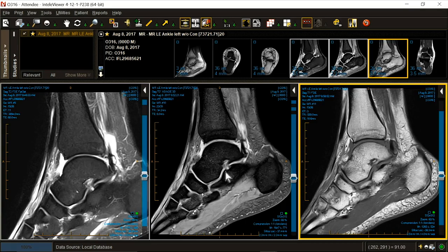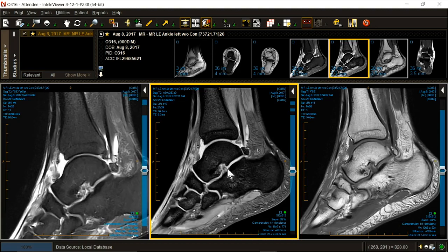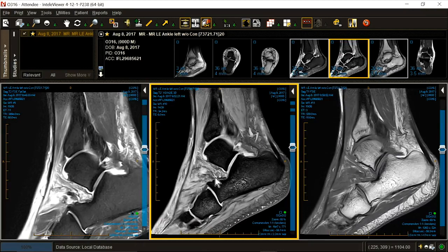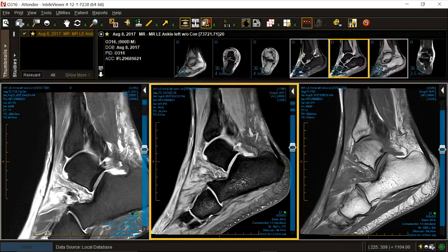Medially, there is a round object that's about 5 millimeters in diameter called the talocalcaneal interosseous ligament. I see a vestige of it right there. As we move laterally, I should see a nice, straight, celery stalk cervical ligament. That isn't nice, straight, celery stalk-like, is it? Most laterally, I should see a nice, straight, parallel, frondiform ligament. I don't. Is there a question?